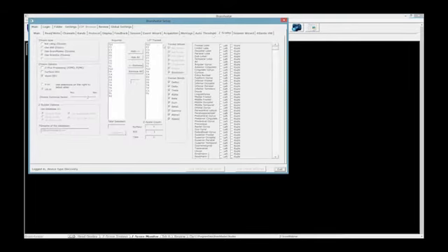So we're just going to go right to the ZScore page, and you're going to notice one difference right off the bat. Well, a couple of them. One, you're going to notice that Voxel EEG is checked right here. That's because when we say sLORETA, we might also say voxels, and a couple other terms. But voxels refers to those tiny little squares that you see in the head map. That is defined as a voxel. It's about 5 millimeters in size, and there's about 5,700 of them in the head. That's how the head's been dissected to do the sLORETA processing.